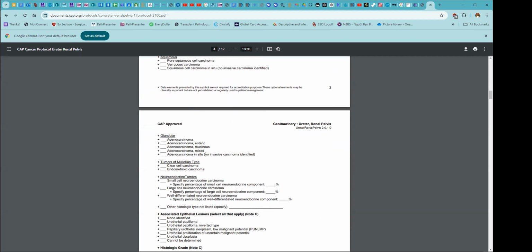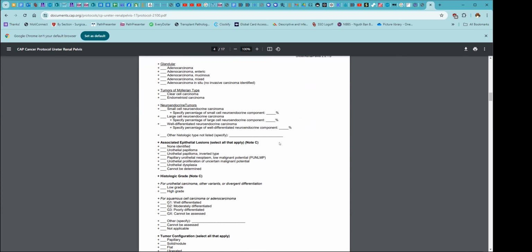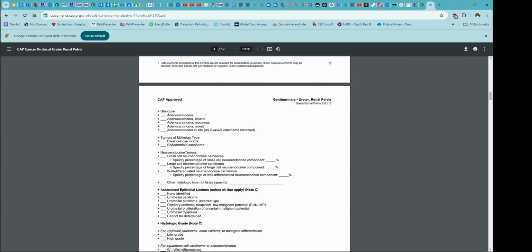At most, it's adenocarcinoma in situ, because I don't think we have invasive tumor in this lesion. But that's why I said at least borderline. I mean, it could be an in situ neoplasm. We don't have a borderline category that's recognized in this location. I suppose you could call it an enteric type of adenocarcinoma. But again, I think this is in situ.